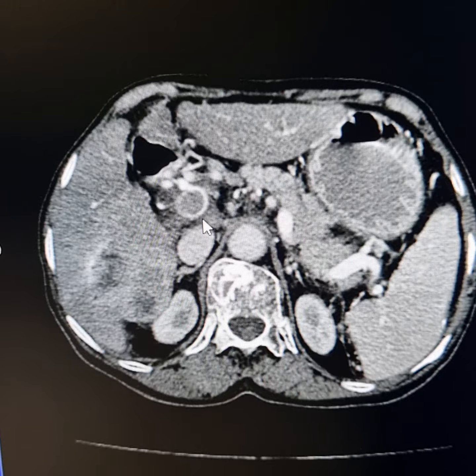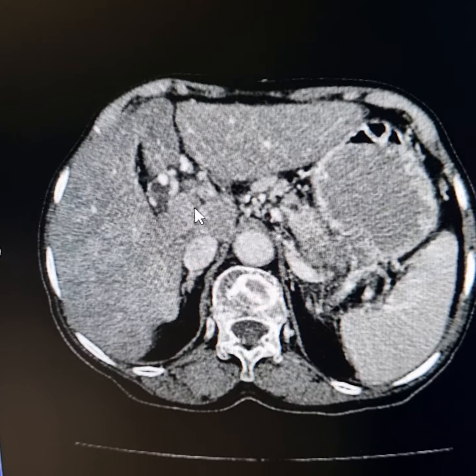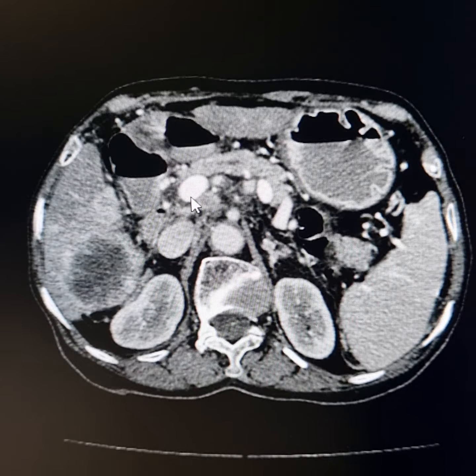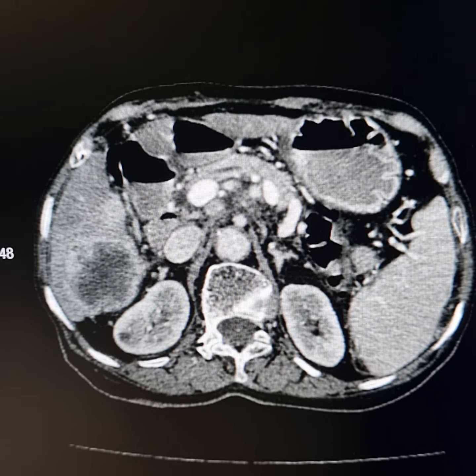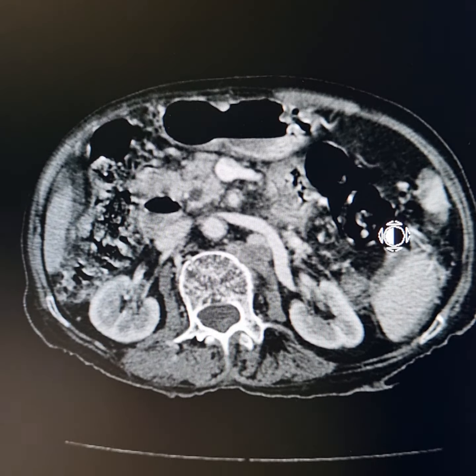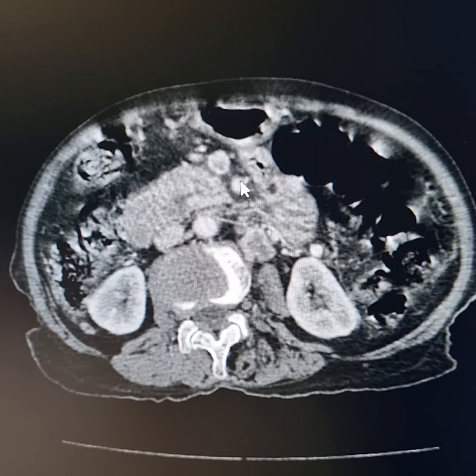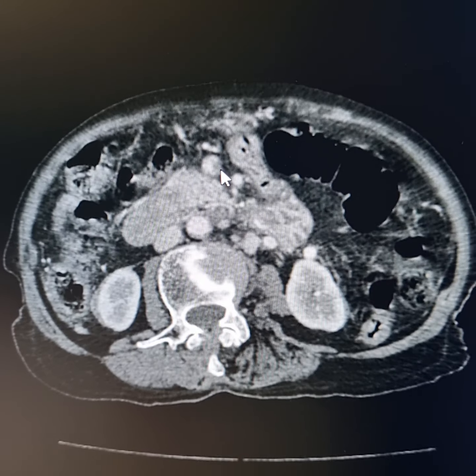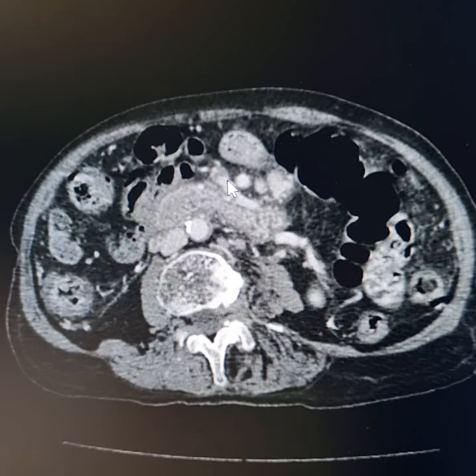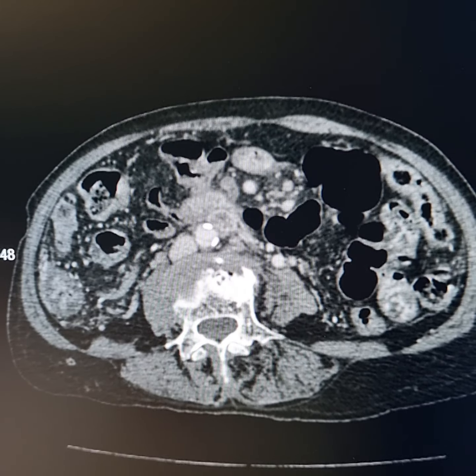Now please observe that this is the bland thrombus here. This is a blood clot at the tip of the tumor thrombus. You may call it a bland thrombus. Now this is the portal vein itself. Now I will show you the splenomesenteric vein. This is the splenomesenteric vein. Since a thrombus is there, this is partly opacified. Please do not be misled that this probably is also a thrombus. It is not a thrombus. I will show you this in the delayed portal venous phase.